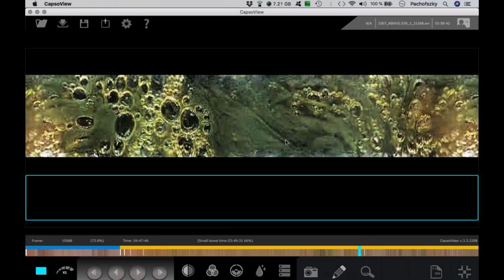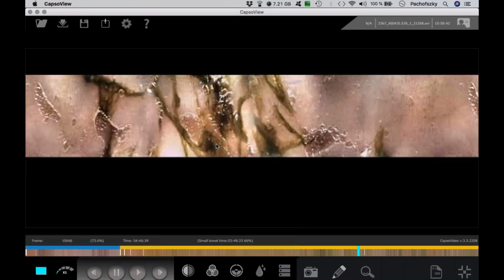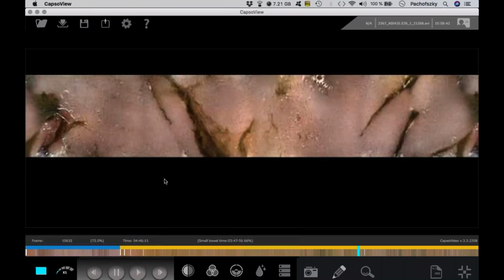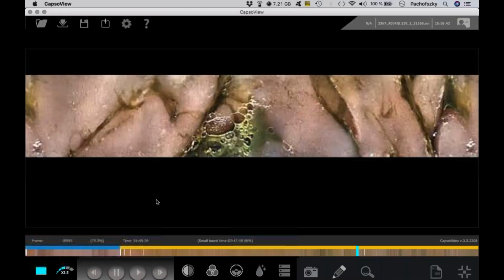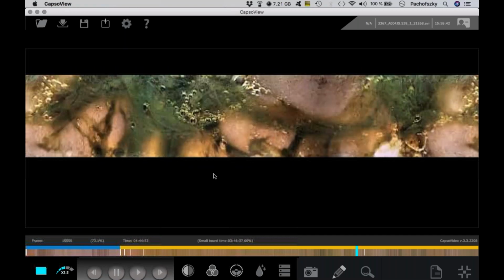So often it's the change if you can see a lot of stool here. So I try to go back. So now we can rise a little bit. So, and now we are inside of the ileum. We go on forward.